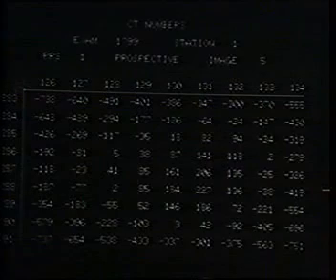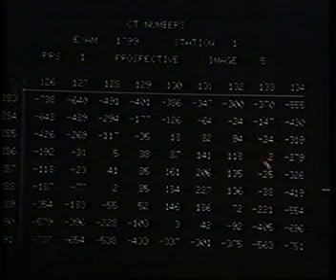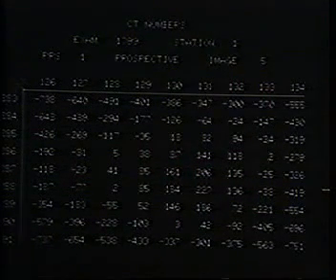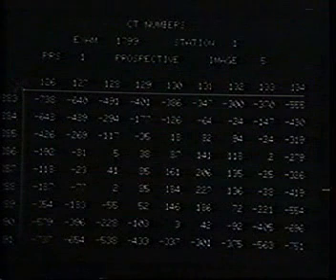with borderline CT numbers, the phantom can indeed be quite helpful, and this is a patient who presents with a small nodule peripherally in the right lung. The phantom is again set up and scanned to look just like the patient. And these are numbers that have been recorded from the patient's nodule, and we can see some 85s and 87, 161, 206, 141, a number of numbers in that nodule above 100, not high enough for us to call calcified simply on the basis of the value itself.